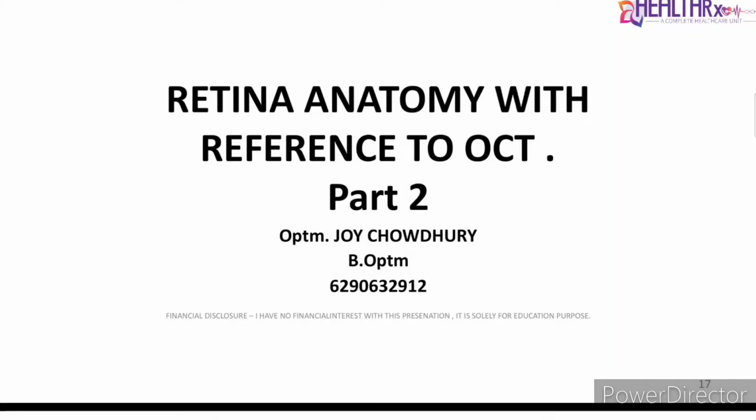Hello everyone, welcome to the second part of the topic, that is retina anatomy with respect to OCT imaging. In the first part, we spoke about the basics of OCT imaging and retina anatomy. In this video, we'll speak about the layers in detail.